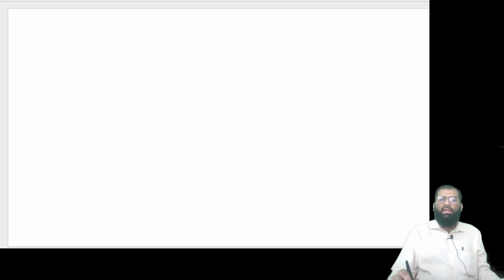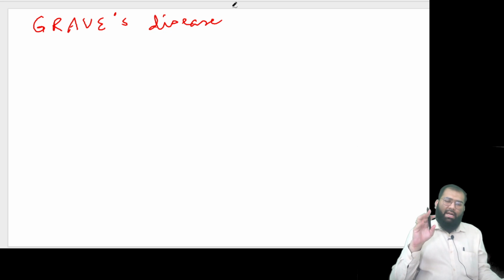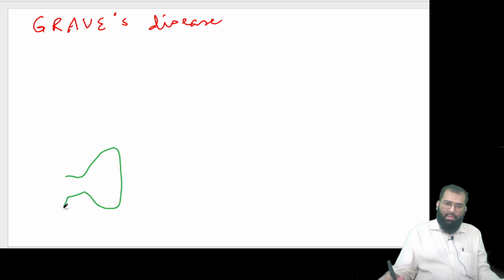Now we come to the next important pathology of the session, which is Graves' disease. This is Graves' disease. Okay. Now I will start with the very fundamentals again. You know that there is a thyroid gland in the neck.